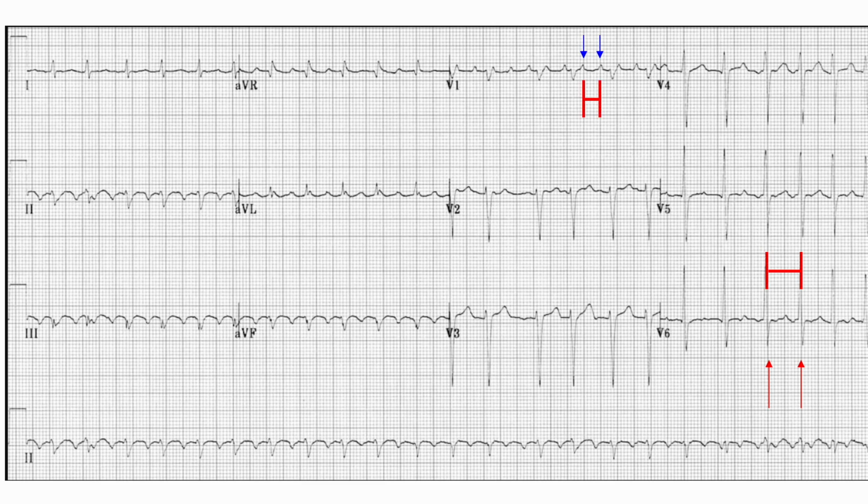Onto our rhythm. So we do not see classic sinus P waves here. Then we see our classic flutter waves for counterclockwise typical flutter, where downwards are negative in 2, 3, and AVF, these inferior leads, which again makes sense based on the direction of our axis that we saw in the last slide, and we're positive in V1.